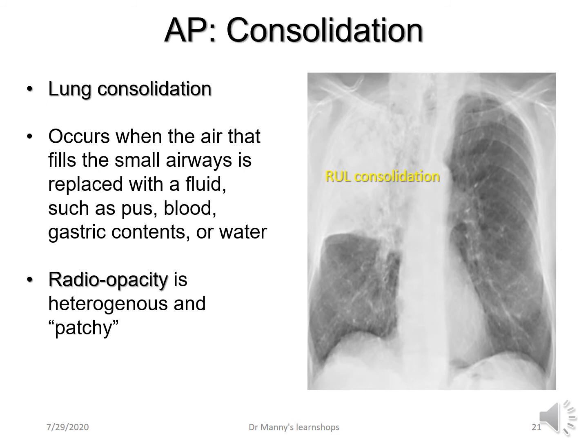This patient here that you're looking at with right upper lobe consolidation would be quite sick. Typically, because it's solid, there's no tracheal deviation, there's no mediastinal shift. It just sits there, but air can't get in there.